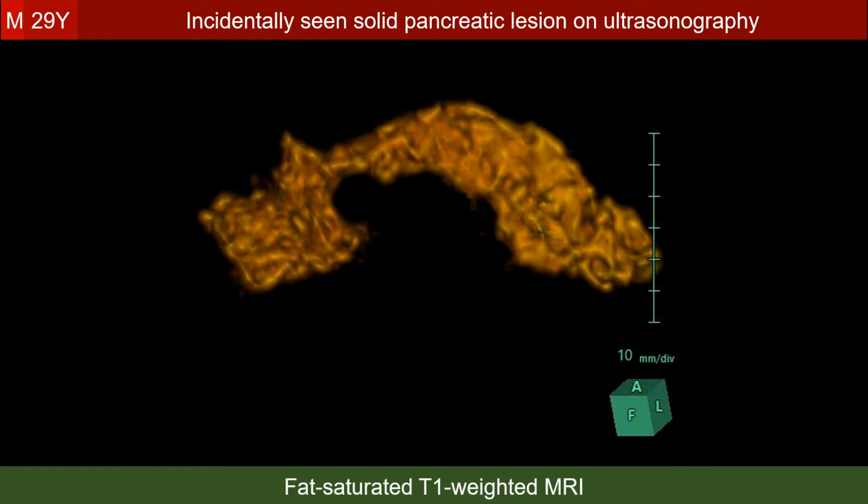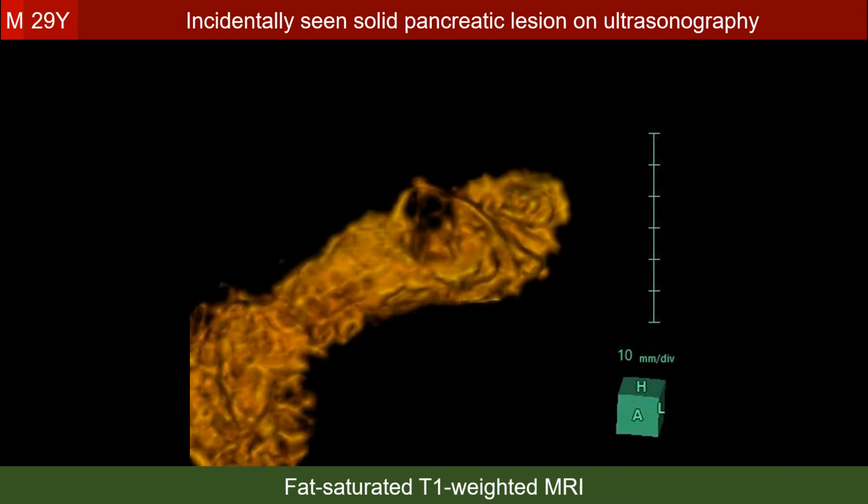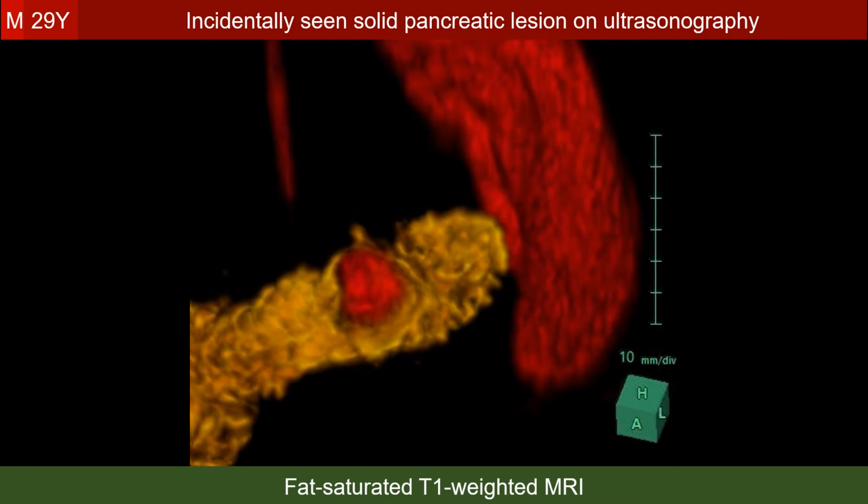It allows us also to generate three-dimensional images of the pancreas, which is the brightest part of its surroundings. And this is a fused image of the fat saturated T1 weighted image plus the diffusion weighted image.